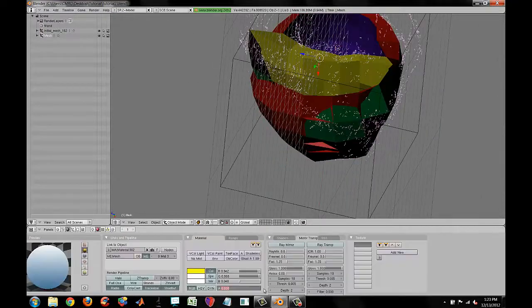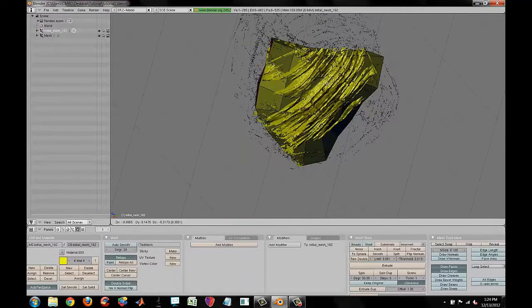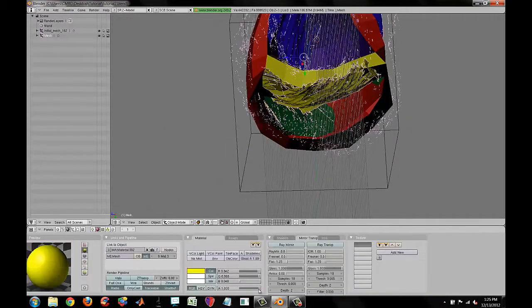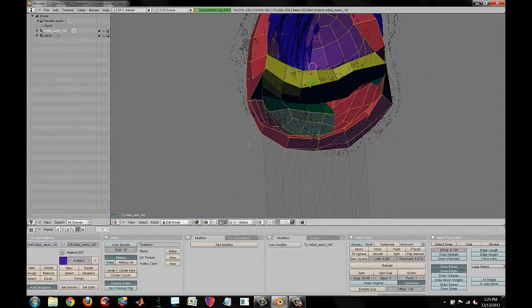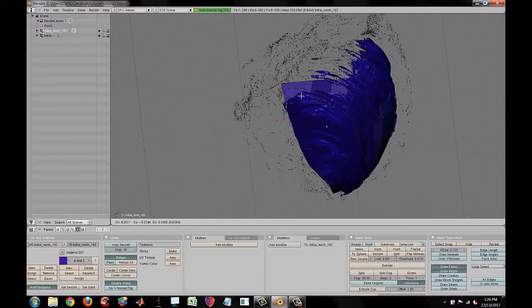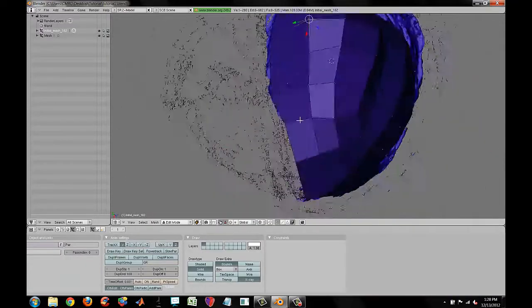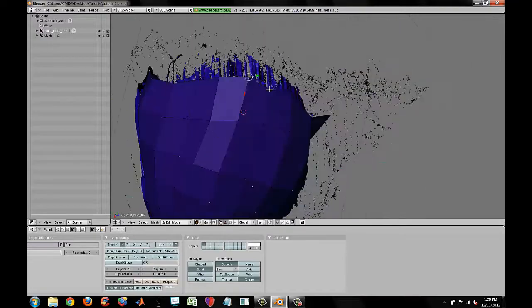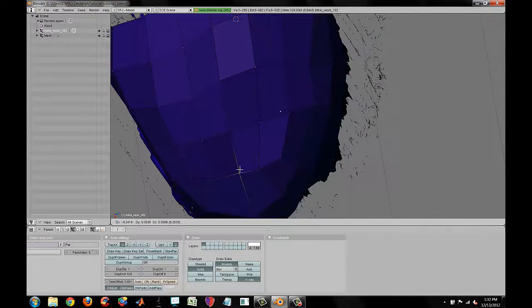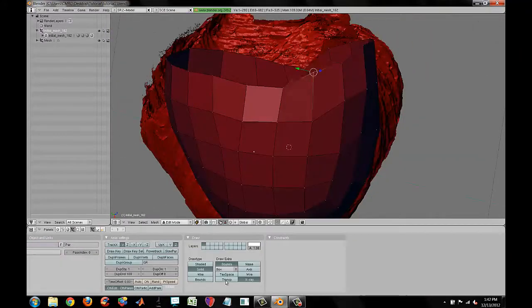Here I see that the node has not been correctly fitted. I just come back to the first septum structure and fit it back to where it is supposed to be. Now for the left ventricle, the fitting is the same principle as before. With the myocardium, again, it is the same principle.